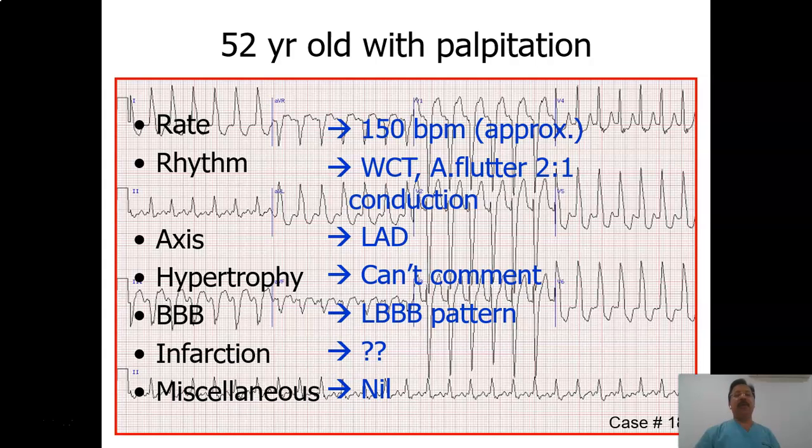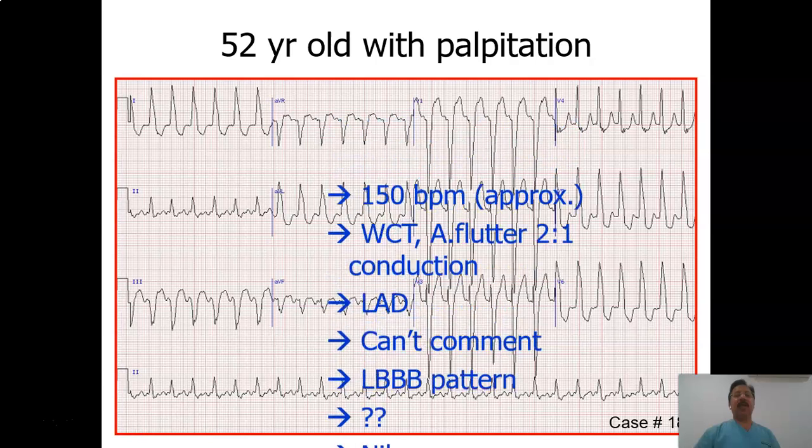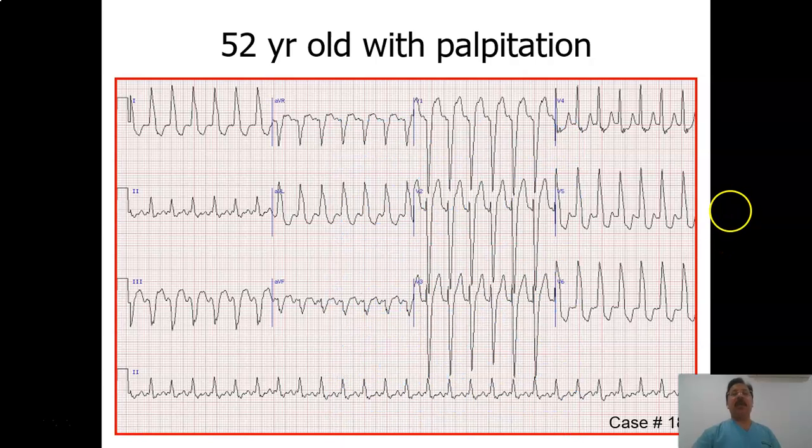And if the patient has chest pain or it's a new onset left bundle branch block, then you can apply the Sgarbossa criteria to rule out myocardial infarction in the presence of left bundle branch block. That includes the criterion that the QRS complexes and ST segment should be in the same direction, but here they are in the different direction. So there is no real myocardial infarction here.